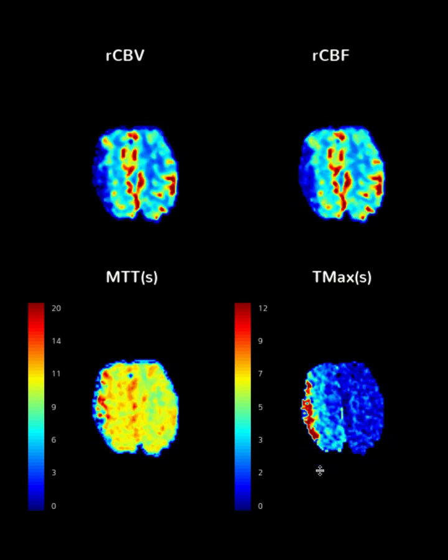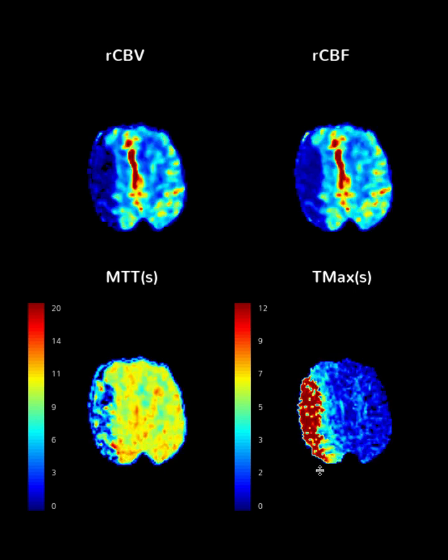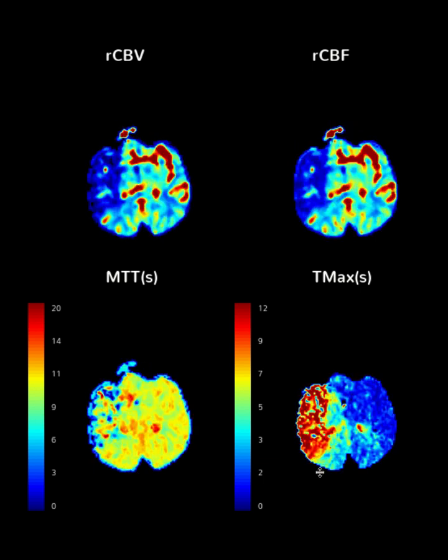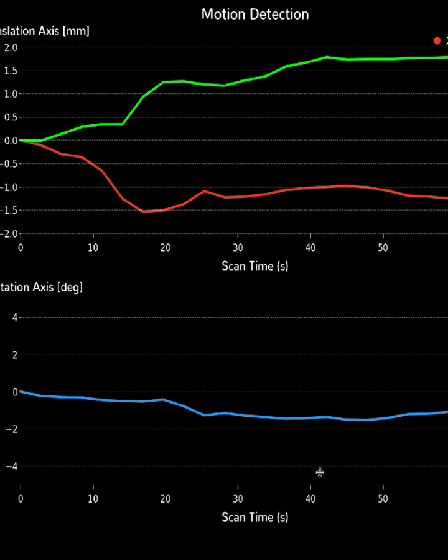So let's go and see what the calculation for the maps is. You have different software, so we can use Rapid software. Different institutions might have different ones. The most common one is Rapid, but the one that I'm currently showing is the Viz software. So let's go see what else it shows.